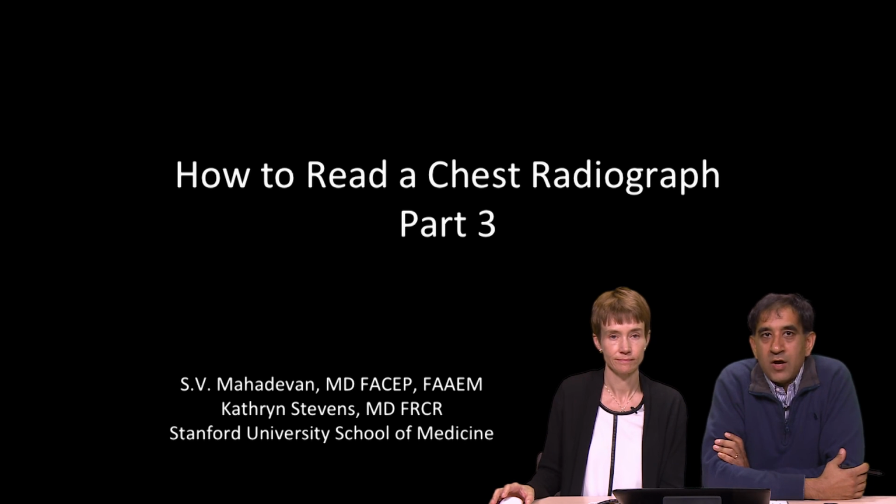Wonderful. This has been How to Read a Chest Radiograph, Part 3, and we've reviewed the airway, bones, cardiac silhouette, and mediastinum, and then finally the diaphragm. Thank you.